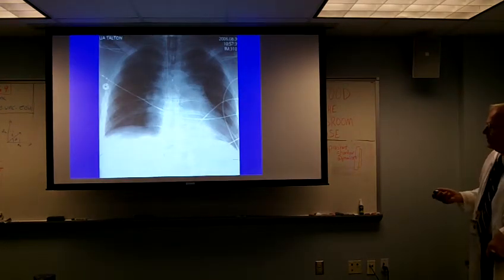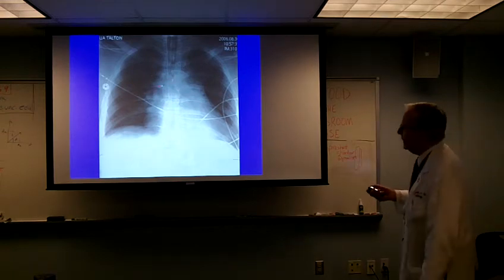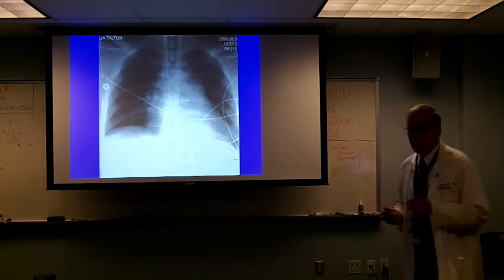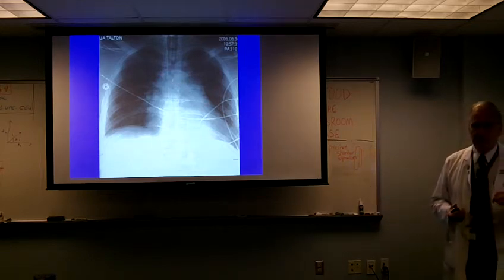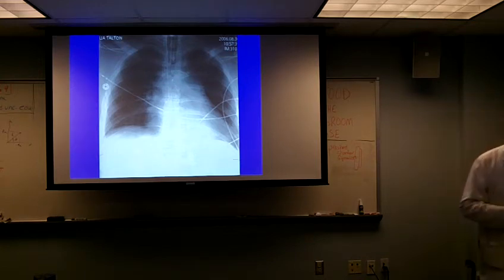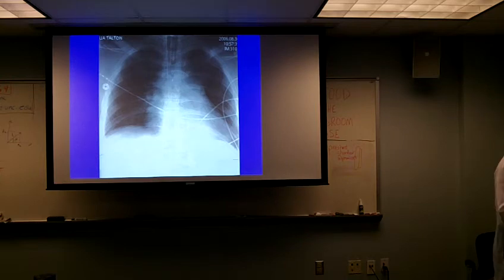The intraosseous infuser, that's this guy right here. It's that little half-moon shaped radiopaque line, and this is actually where the IV tubing connects to the intraosseous infuser. And those things will take a surprisingly high rate of infusion.